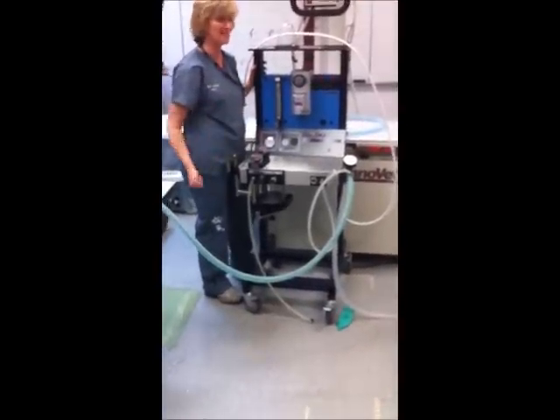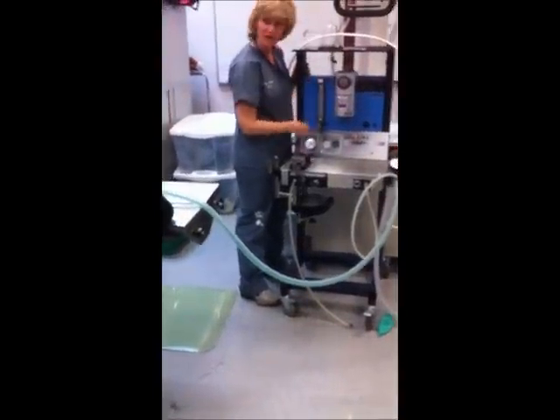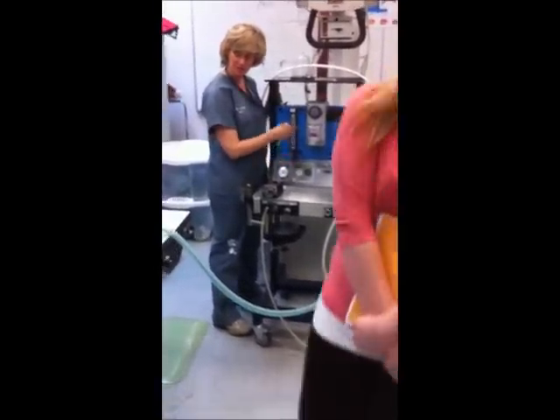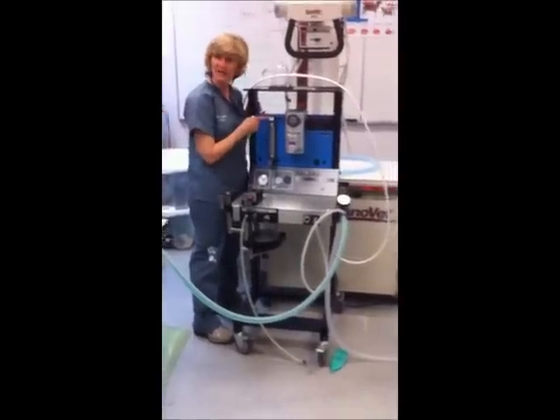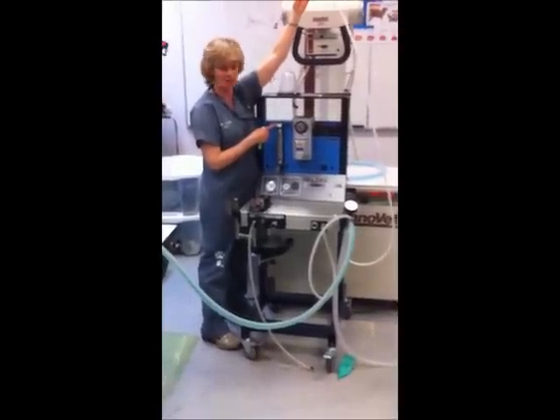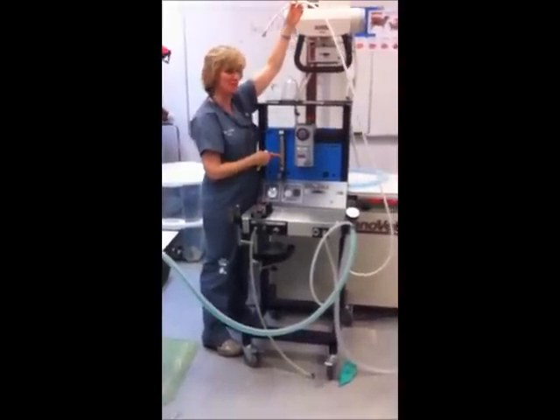Everything else, fair game. Ruth, what did you say before with the vaporizer? So your oxygen flow meter, know where it is, know what it does. This is what decides how much oxygen is going to my patient. Do you mean like where it is on the actual machine? On this machine. Where is it? There it is. There's O2 right there. But don't get that confused with this O2, because this just gets oxygen coming into the machine. This decides how much is going to my patient. Okay? And this is measured in liters per minute.